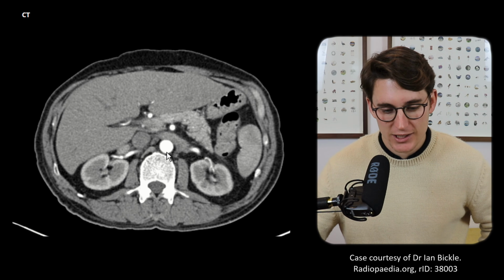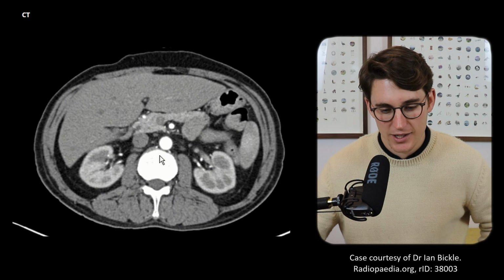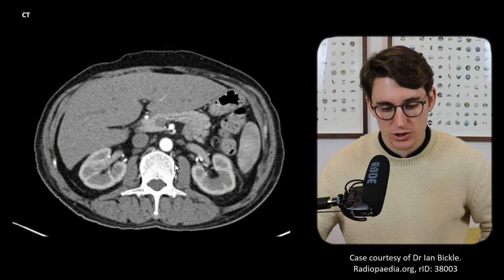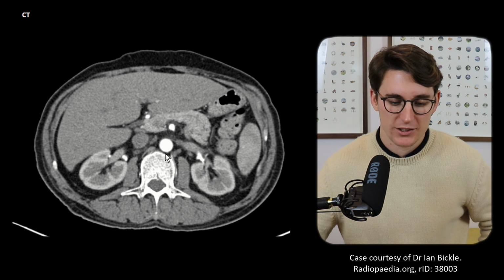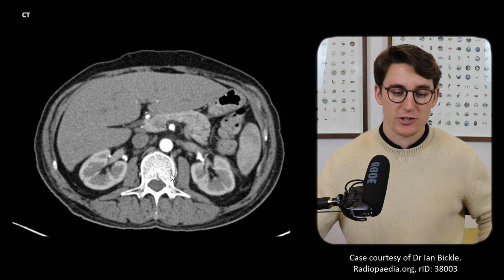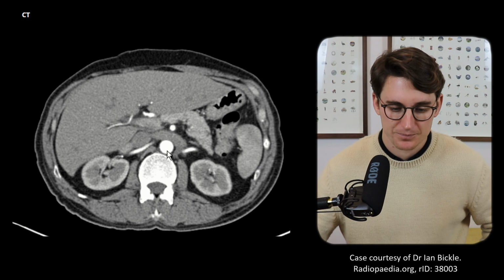As we head down, you'll see that posteriorly there are arteries coming off the back of the aorta here, heading medial to our psoas muscles and our quadratus lumborum muscles, and those are our lumbar arteries that are supplying blood to these posterior, these retroperitoneal muscles, as well as our vertebra and our intervertebral discs.